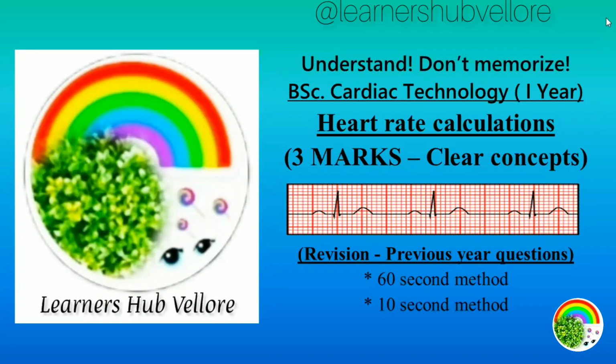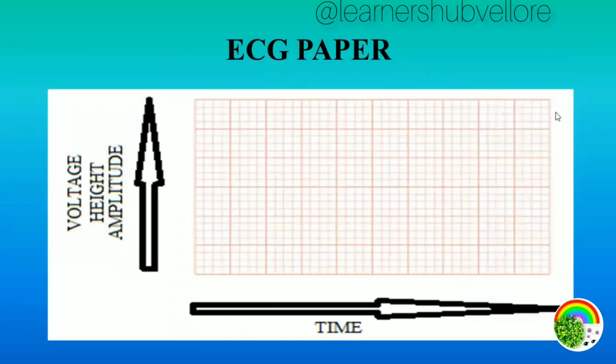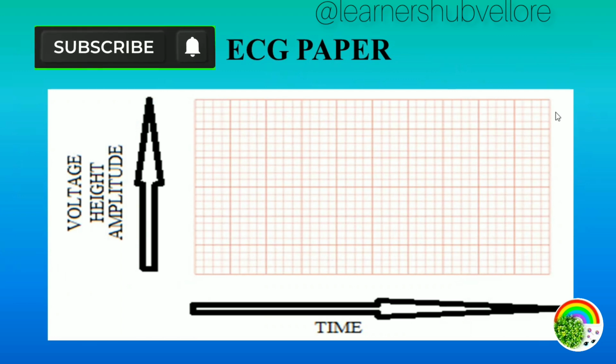In this session, we will revise all the heart rate calculation problems. If you are revising for your exam, it will be really helpful. This is an ECG paper. I have just shown it for a sample.